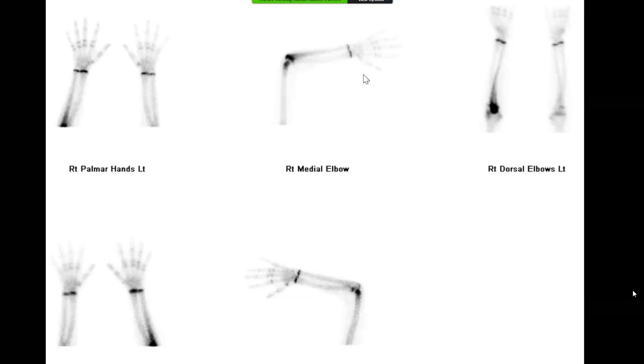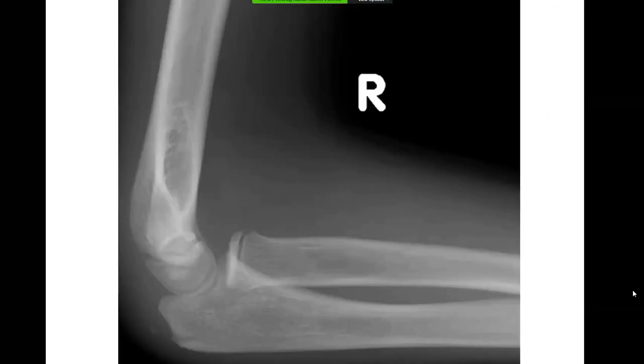Right, sir. So this patient is most likely to have a proximal ulnar fracture. So let's go back to the X-ray, which was reported normal. And now we have seen where the abnormality is present. So can we retrospectively be clever? Yes, sir. This is the lateral projection of the same child.